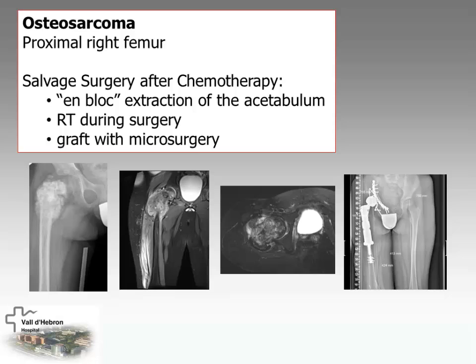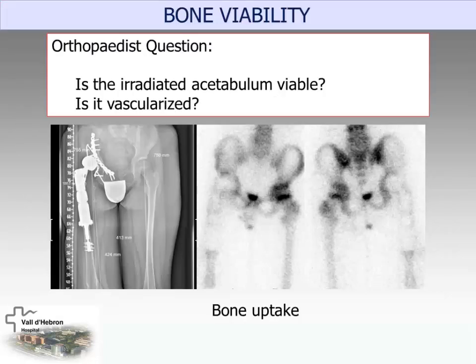And they ask, just 10 days after the surgery, if this block is viable. And what do we perform? In this case, just a bone scan, but the bone scan had the answer to this question. What do you think? Is this bone, this irradiated acetabulum, viable or not? Can you see bone uptake on the acetabulum? Yes. Look.